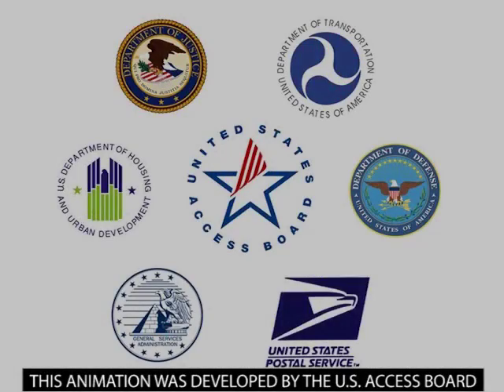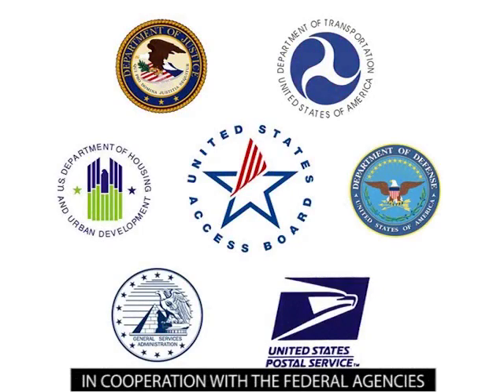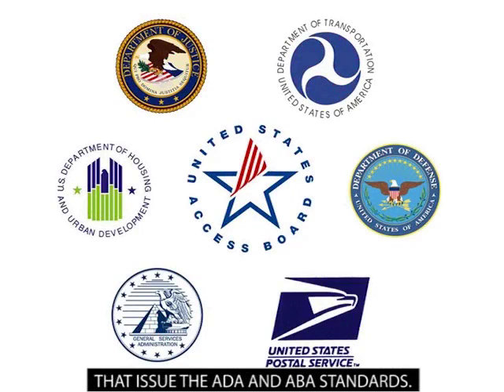This animation was developed by the U.S. Access Board in cooperation with the federal agencies that issue the ADA and ABA standards.